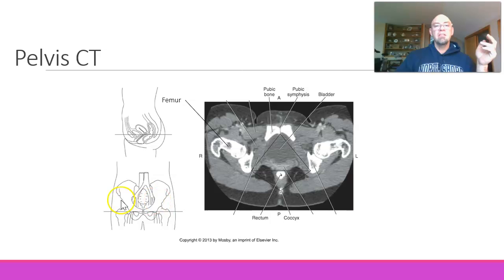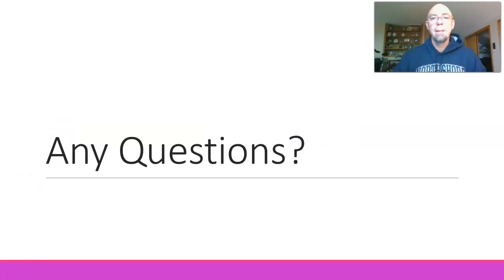If you see something this low on a CT image, the main organ of interest is going to be the bladder. So that's pretty much it. If you have any questions about that, let me know. I know there's not a lot, but I think you get the gist. If I gave you an image of the abdomen, you'd be able to pull out most of that stuff, no problem. All right, guys, I'm going to stop here. That's it. As far as cross-sectional anatomy or getting a basic understanding of what you're looking at, that's all I really want you to know at this point.